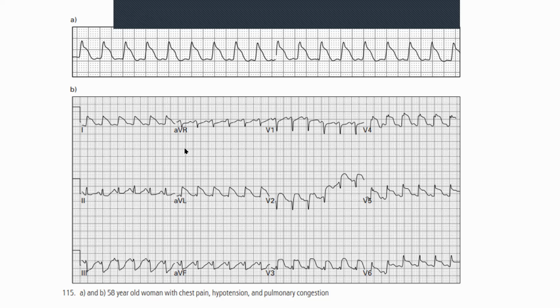When we come to the lateral side, that's when we see what we would have assumed was a ventricular tachycardia. It's actually a very elevated RS pattern that's following similar to this. And you can even see it in V2, it's forming like a tombstone that's going up over there. These tombstone RS complexes are very difficult to differentiate from VTAC if you only look at a rhythm strip, for example.